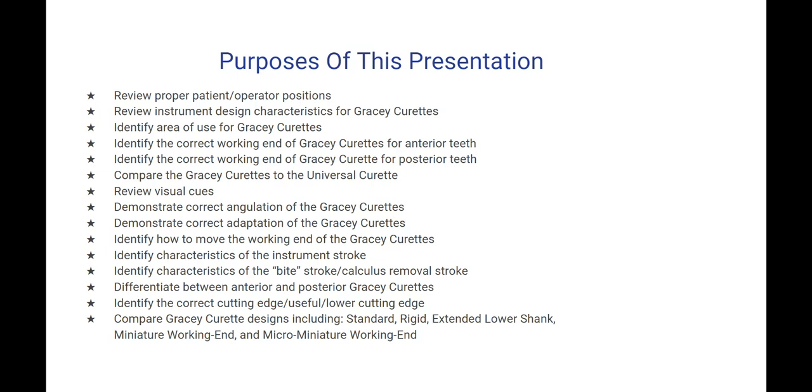Purpose of this presentation. Review proper patient and operator positions. Review instrument design characteristics for Gracey Curettes. Identify area of use for Gracey Curettes. Identify the correct working end of Gracey Curettes for anterior teeth. Identify the correct working end of Gracey Curette for posterior teeth.